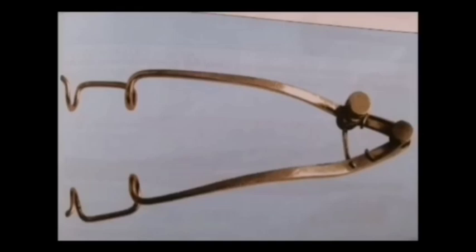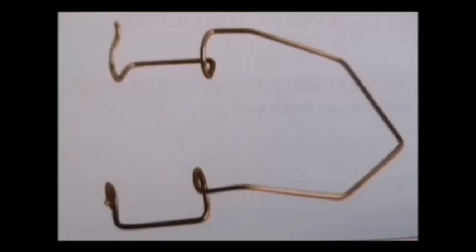So moving toward the next one. Do you know this one? It is basically a wire speculum, right? So we do have two types in the group that is called lid speculum. The one is eye speculum with screw and the other one is wire speculum. Now we will move toward the forceps, the different types of forceps.